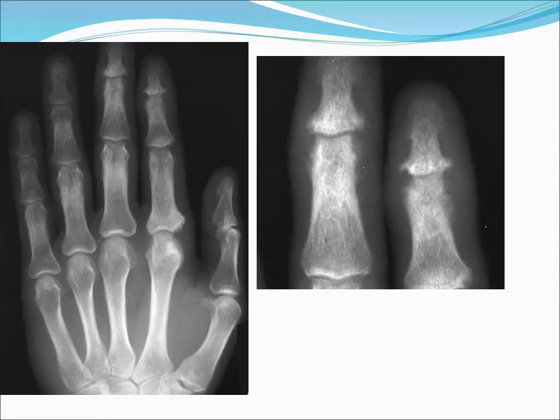AP view of the hand reveals marginal erosions and soft tissue swelling involving the DIP joints of the index and long fingers, shown to better advantage in the cone-down view, Fig. 2. Note also the associated areas of ill-defined, fuzzy bone proliferation, arrows. Final diagnosis is psoriatic arthritis.